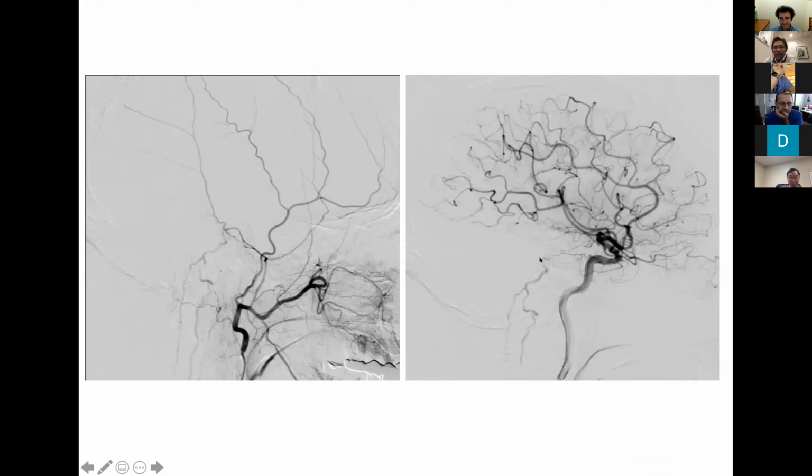and you can see that the shunt was close to the tentorium, or maybe the area of the superior petrosal sinus. It could drain through the superior group to the vein of Galen, or through the petrosal group, or posteriorly to the torcular.